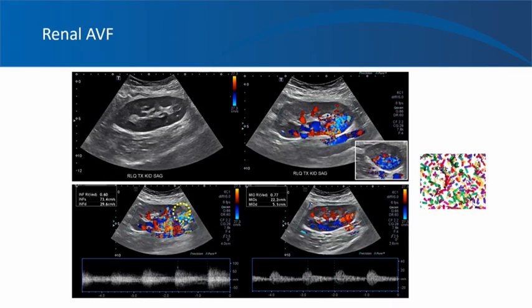After resistive indices, I just wanted to show you how a fistula looks inside the kidney, which is pertinent to point of care ultrasonography. So this is a renal allograft sonogram in a patient who underwent biopsy 4 months ago. The grayscale ultrasound looks okay, nothing really abnormal. But when you turn on the Doppler mode, it demonstrates prominent vascularity and turbulent flow with a mixture of colors in the lower pole, which is suggestive of arteriovenous fistula, probably involving segmental and interlobar blood vessels.